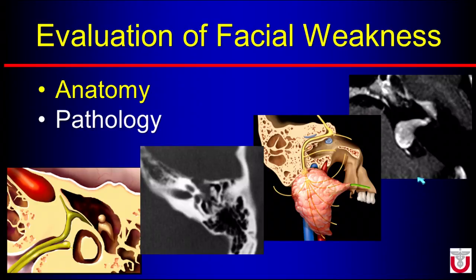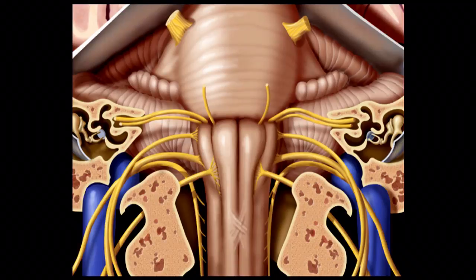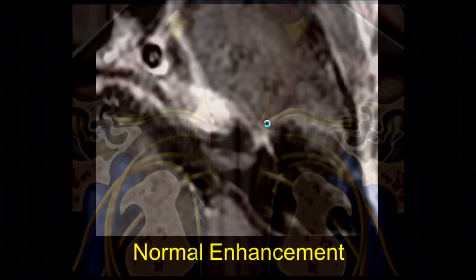The important thing is to think about any pathology in an isolated cranial nerve deficit problem. So again, just like that anatomy, we're going to start with pathology centrally and go out distally along the facial nerve course. So here's the pons, here's the medulla. So there's the pontomedullary junction. Here's 6 coming out off midline, and we see 7 and 8 here ventrolaterally going over to the IAC. So we think about any pathology that can happen along that course.